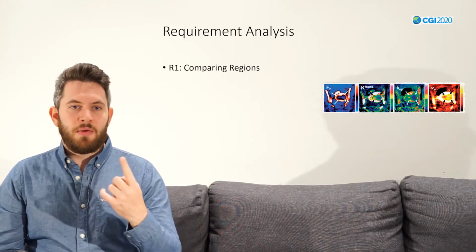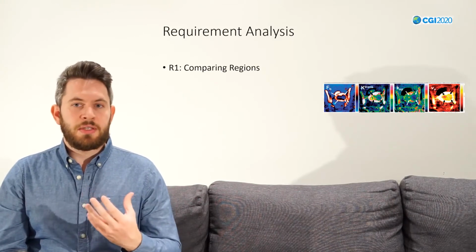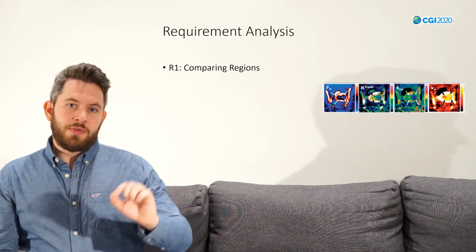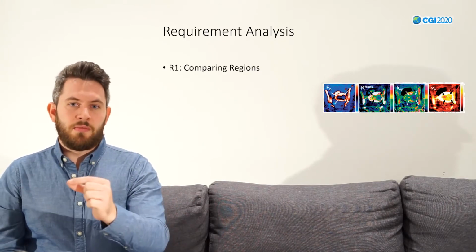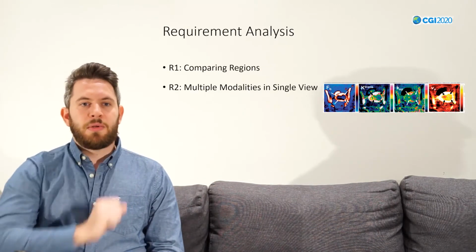There's requirement 1, comparing regions. The radiologist told us it would be interesting for them to compare regions, for example, within the tumor and outside of the tumor, but also within one patient and then compare it to another patient. Then we have requirement 2.